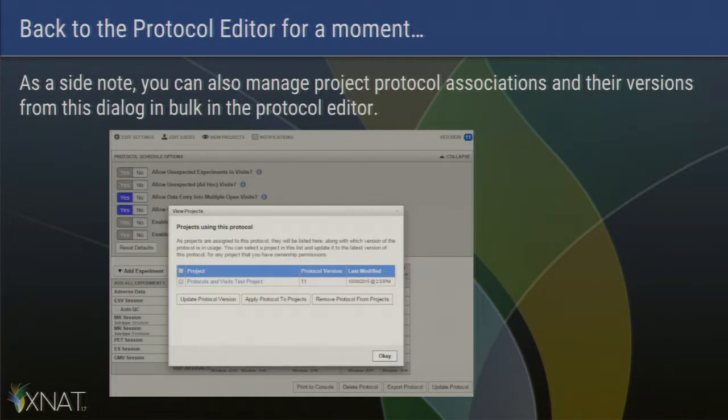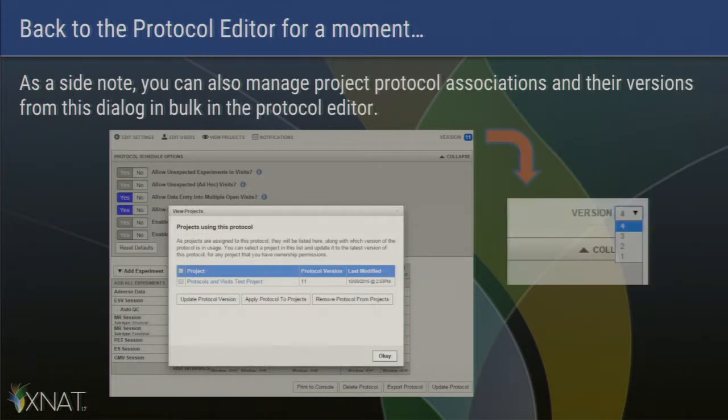And again, back to here. This is a place where now that it's added there, they're called different. I got screenshots from different versions. Don't pay attention to the version there. But anyway, that's just how it'll look in there. And the version that you're actually selecting is up on the top there. So I don't know.